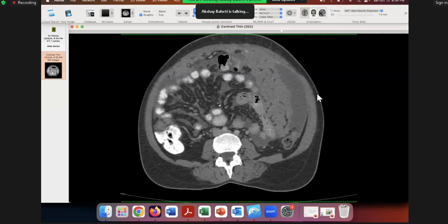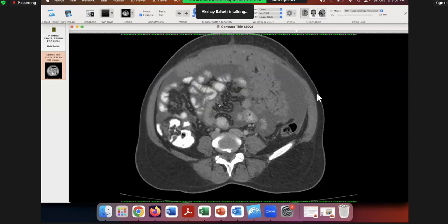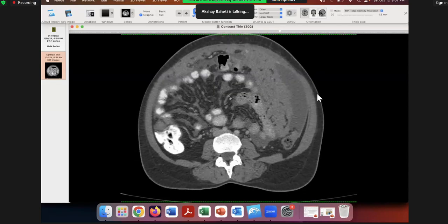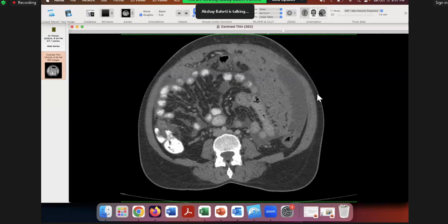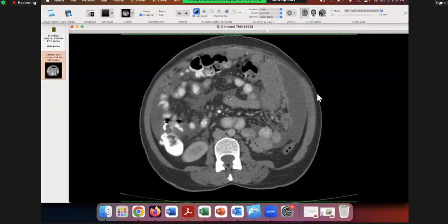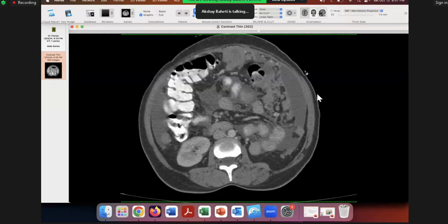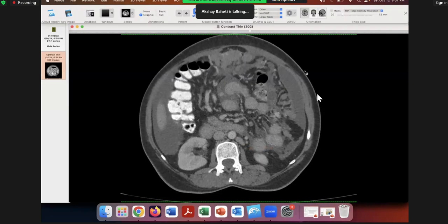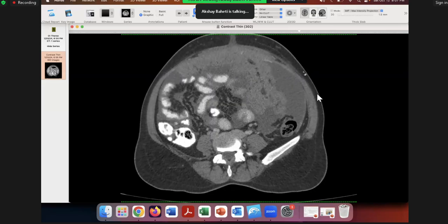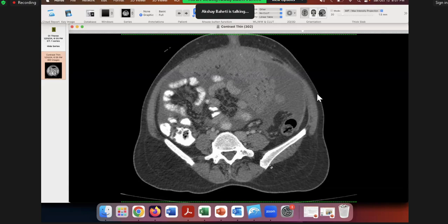Look at the mesentery. It's sometimes a very soft call. It's very difficult. Here it's very obvious, we can see deposits. Sometimes it's just some minimal stranding and fluid, and at those times I will not call it deposits. I will undercall it because you don't want to make the patient inoperable. You can say, listen, I'm not sure, perhaps give neoadjuvant chemo and then we'll assess again. But if after assessment also it's 50-50, they will always go ahead and operate and figure it out intraoperatively.